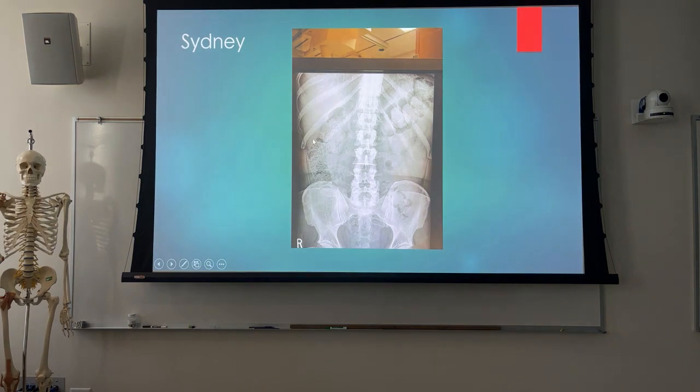And Sydney, do you have anything on this one? No. You're gonna have to take notes. So again, bladder shot, I maybe didn't submit that image, I mean. What's that? I didn't submit that to you, so. It had your marker on it though.